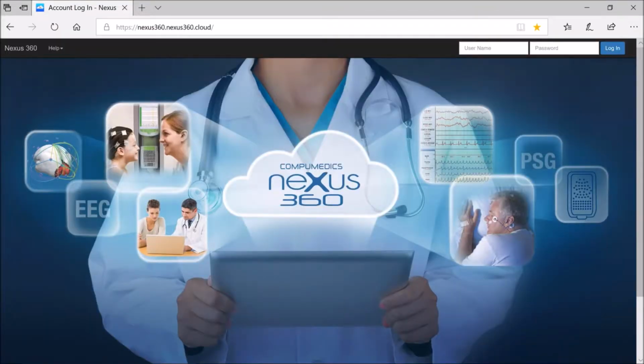Hi, in today's video we're going to show you how to alternate between opening a single study in either Profusion PSG or Profusion EEG software within neXus 360.